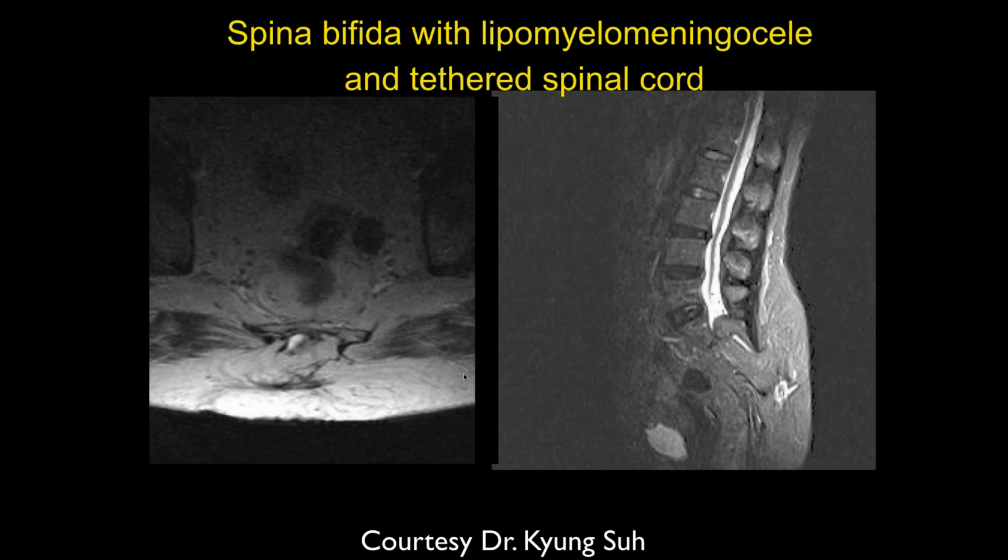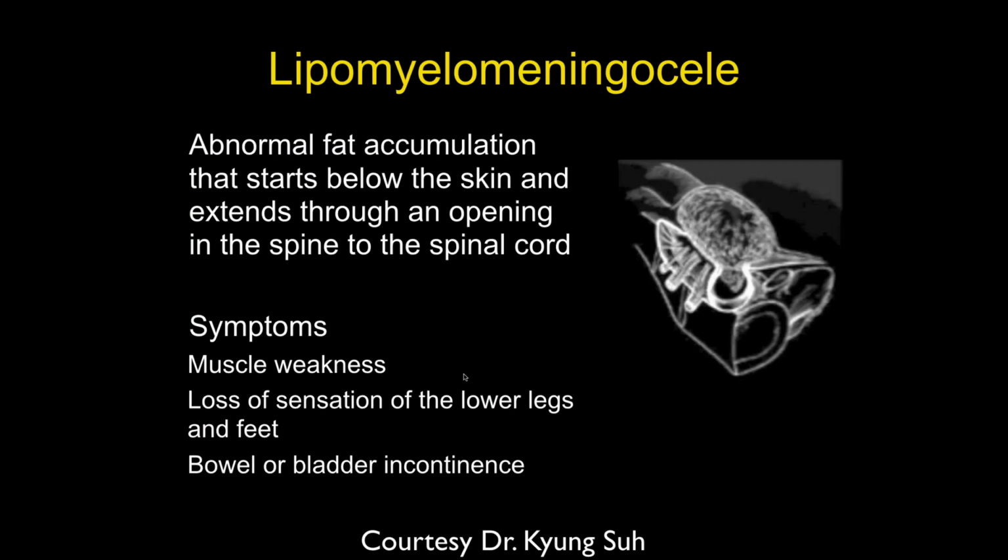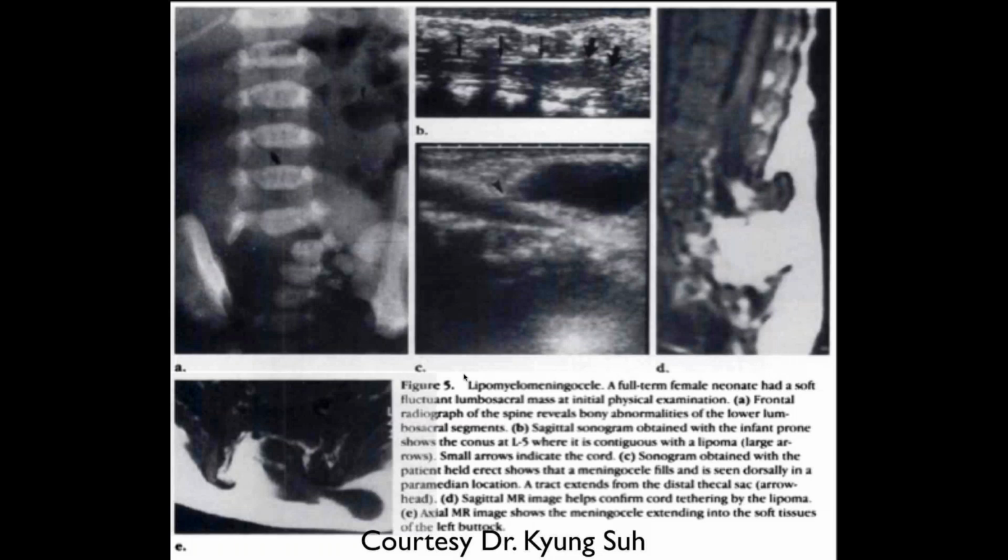There you go. Spina bifida with lipomyelomeningocele and a tethered spinal cord. Yeah. So that's a lipomyelomeningocele. And then just some literature on it.